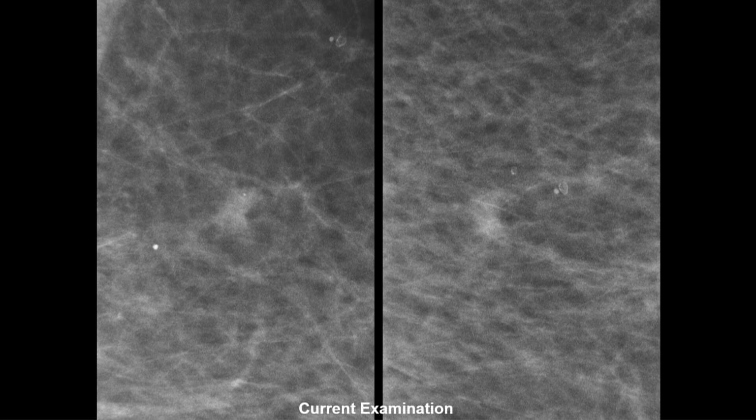Okay, look at it up close, full pixel resolution. Concave outward contour. It's very hard with these very small ones, these 5 millimeter ones, to see it's interspersed with fat, because it's just not big enough. It's the same thing when you're looking at rim type calcification. The smaller it is, the harder it is to see the rim, because there's no center.